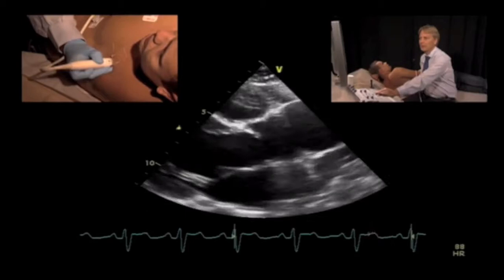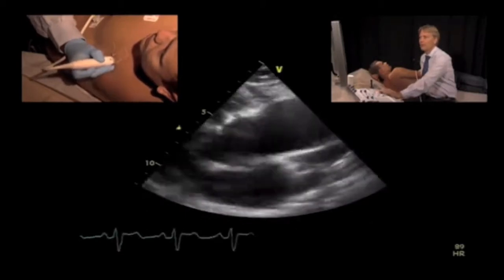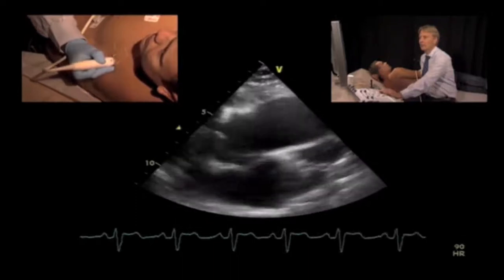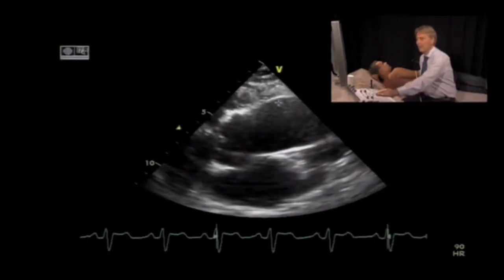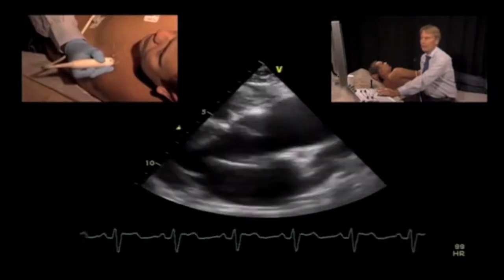Here in systole, there's doming of the valve. And in addition, the ascending aorta is also dilated. So this together with the morphology of the valve is almost indicative of a bicuspid aortic valve.